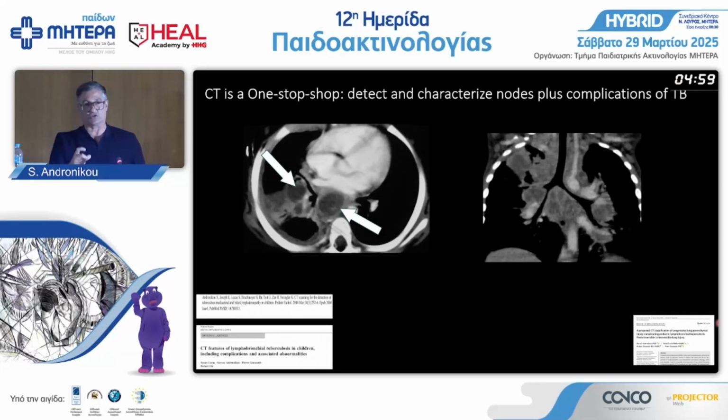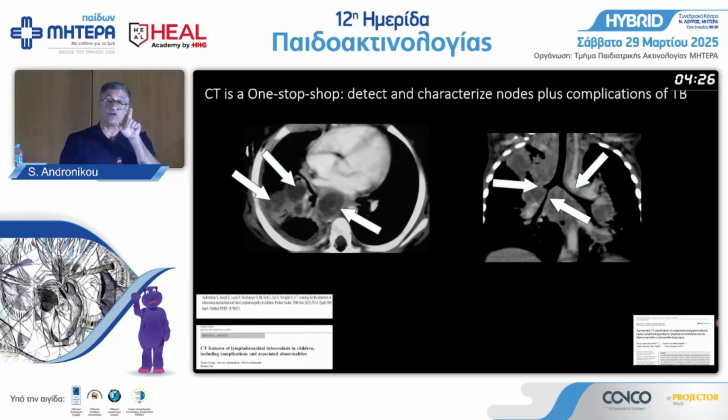And you will see as I progress through this talk, which is not going to be that long, that airway compression is not just important for diagnosis. It's important because of the disease distal to a bronchial compression. So have a look at the coronal. On the left picture, you can see parenchymal disease with some necrosis. Now, if you look at the coronal in this particular patient, there's 3 areas of bronchial compression. But the right upper lobe bronchus is completely obstructed, okay? And you see the parenchyma in the right upper lobe. There's an area with breakdown, and there's an area that's not enhancing. Those are non-recoverable areas. That is our grading. We've written this paper in the right-hand corner, grading the parenchymal disease distal to an obstruction of a bronchus, okay?